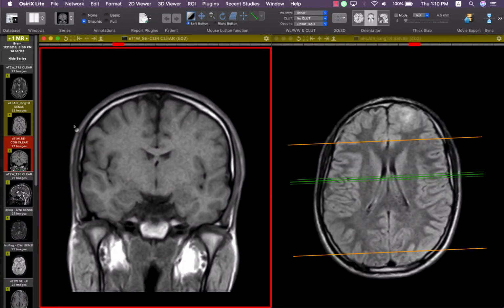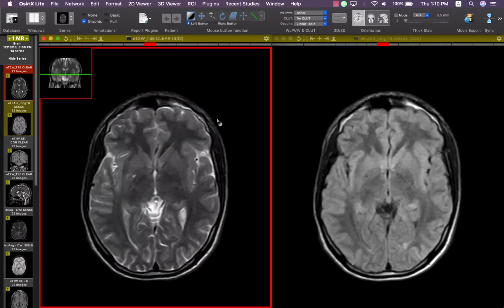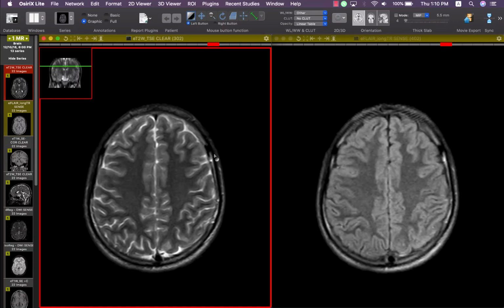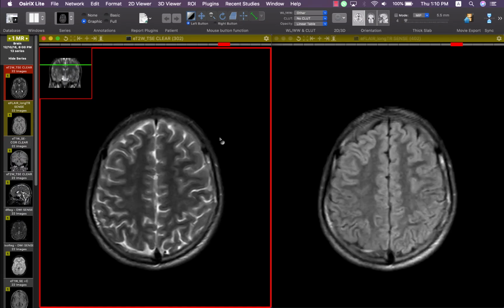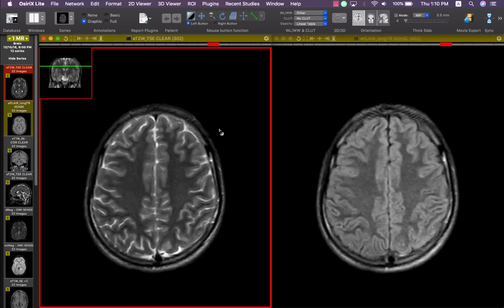As important as looking at the temporal lobe is, it is also important to look at the cerebral cortices, because there is a lesion that commonly affects the cerebral cortices and causes epilepsy, and this is one of the commonest causes of epilepsy, which is called focal cortical dysplasia.